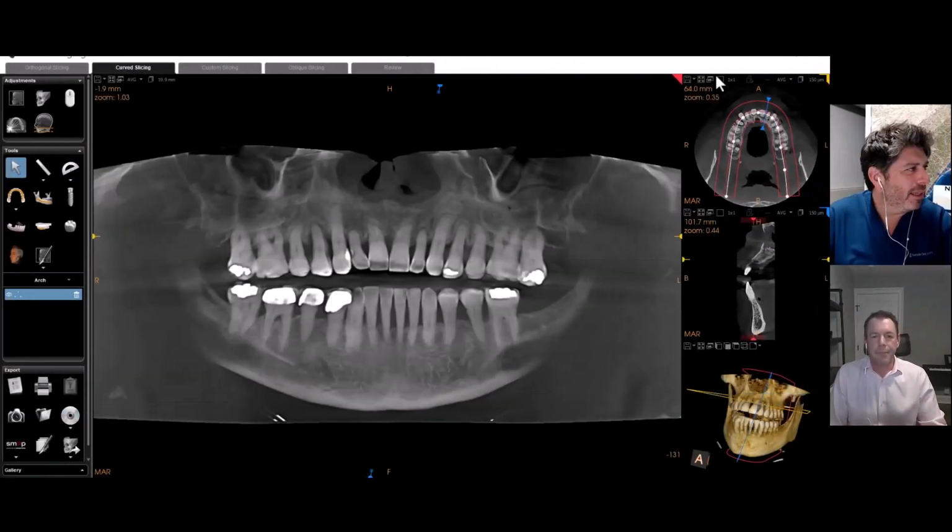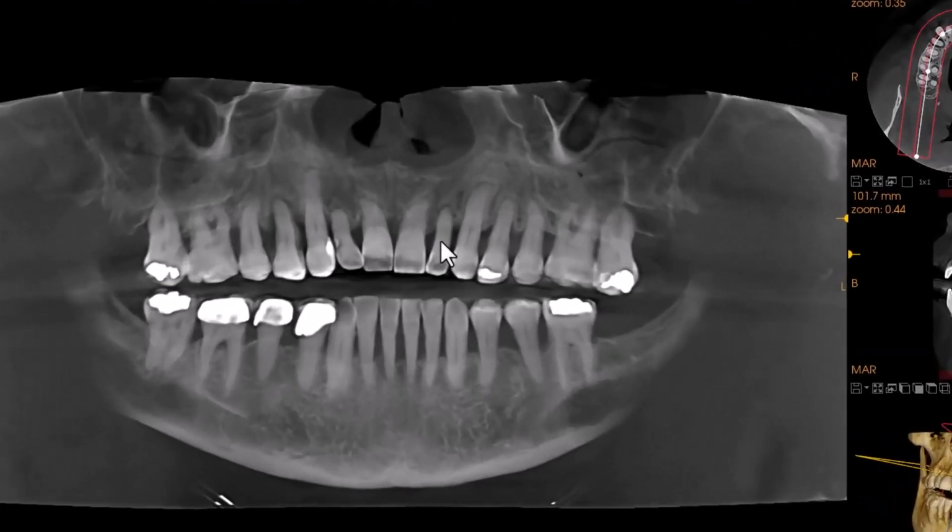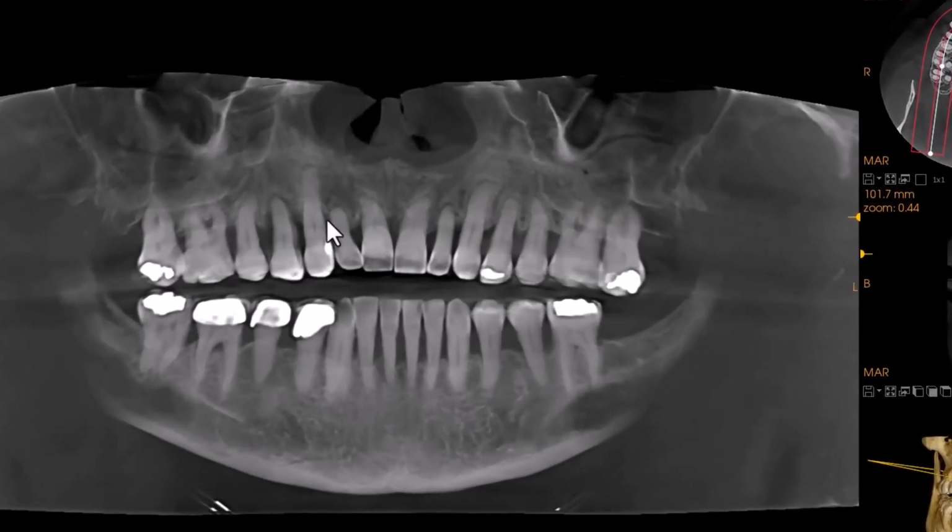All right, Phil, let's talk a little bit about a case like this. A lot of oral surgeons and surgically minded dentists are seeing this type of case. Patient comes in, take a look at the big picture. You see there's generalized, pretty severe bone loss. You see short roots, and like I said, a lot of bone loss. And you have a patient who presents for one specific issue, and that issue is that he came in after having bitten down on something, and tooth number 10 is loose.